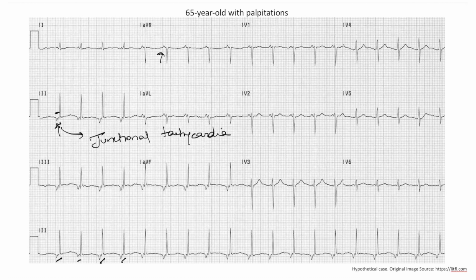So the reality is, when you look at an EKG, being able to point out one specific diagnosis can be challenging in some cases. However, the EKG would still help you narrow the number of differentials you have, and then using the patient's history and prior EKGs, and maybe in certain circumstances, even EP studies, you might be able to pinpoint the diagnosis.